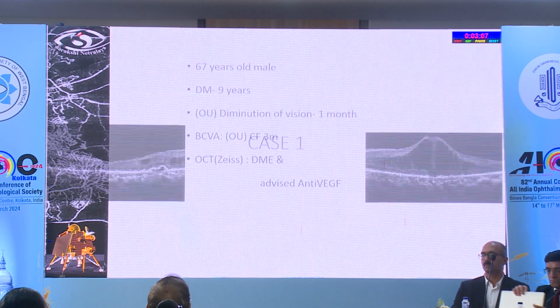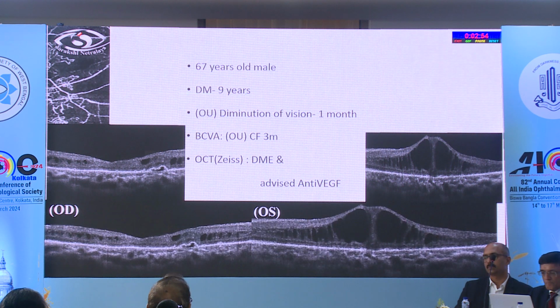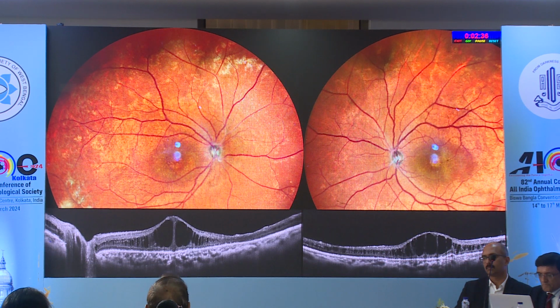Now this is another case, a 67 years old male who was advised to have diabetic macular edema. He was a diabetic patient. He was diagnosed elsewhere as diabetic macular edema and was advised anti-VEGFs. Well, when we did a Widefield OCT, our way of looking at the disease changed, as I could see the schitic cavities, in both the eyes, extending quite into the periphery. So it was not just simple diabetic macular edema, but this was a case of a macular edema along with a retinoschisis in a case of a diabetic.